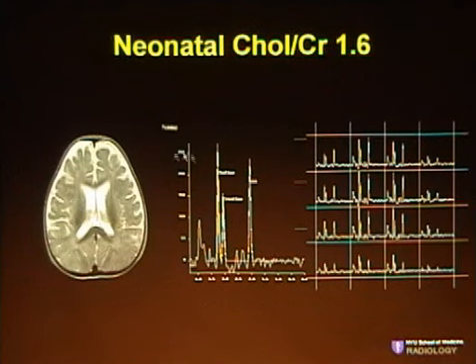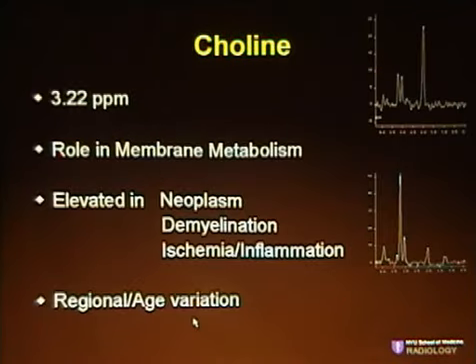Okay, so a little difficult, and I felt initially that this was abnormal because the MR certainly looks abnormal. There's some volume loss in this neonatal brain. Shouldn't be seeing so much extraaxial spaces. So initially we weren't really sure, so I sent the case to Bob Zimmerman up in CHOP, and he looked at it and he said, I agree with you that the MRI wasn't normal looking, but in fact this MRS pattern is in keeping with the neonatal brain. So keep that in mind, that this can be normal.